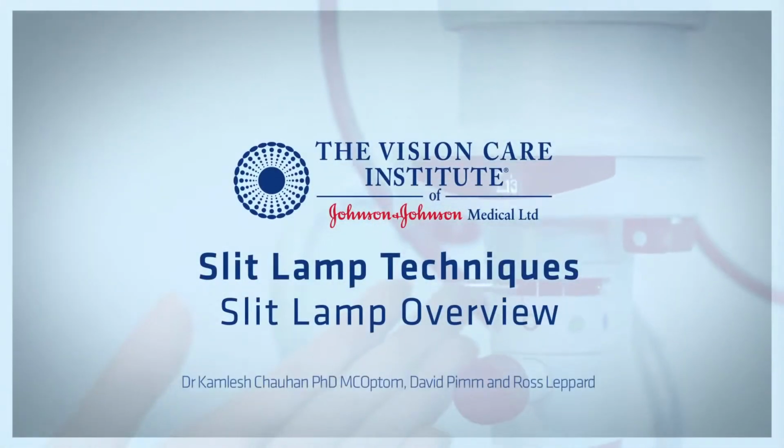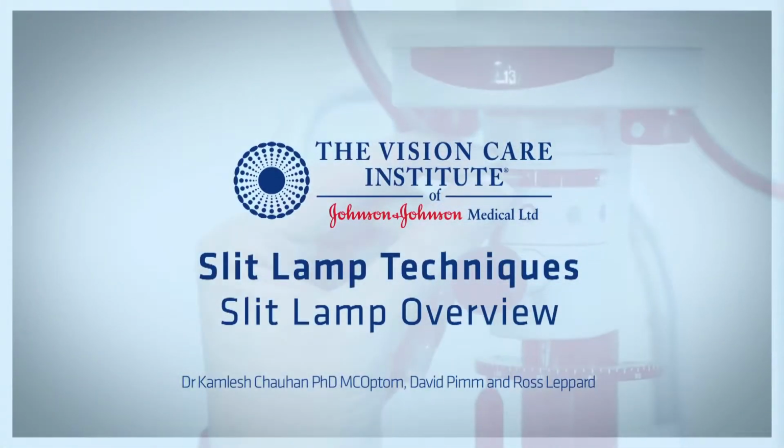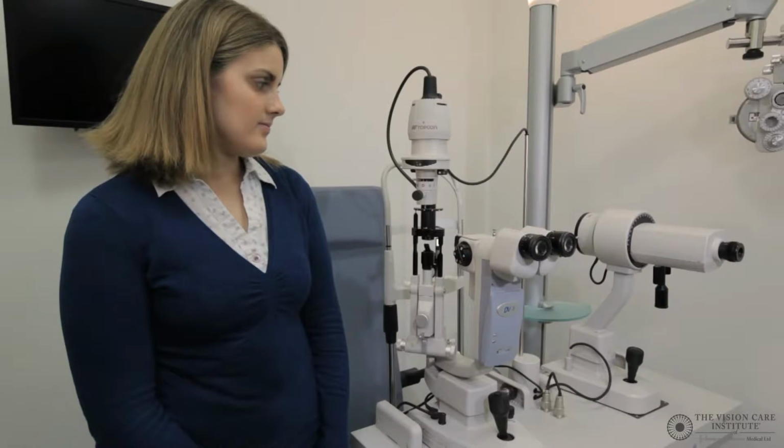The slit lamp is one of the most versatile instruments used in eye care. This video illustrates the main components of the slit lamp and how they interact. Slit lamps are generally classed into two types, Zeiss or Haag-Streit. The key difference is that the Zeiss type has the illumination system below the main mirror and the Haag-Streit type has the illumination system above the main mirror.